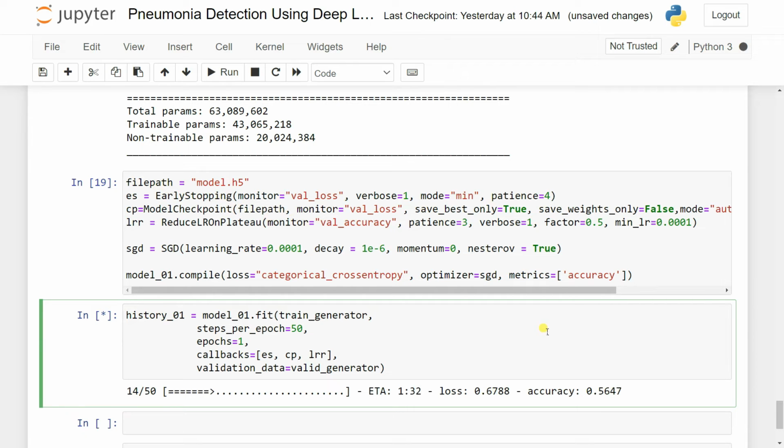Okay, I'm not going to plot the accuracy curve here. That's your task. How can you do that? You can check my brain tumor image classification video, where I already discussed how to plot the accuracy metrics and so on. Otherwise, no problem. I can also give one clean code where you can get everything, like the accuracy curve, the ROC curve, and all of that.